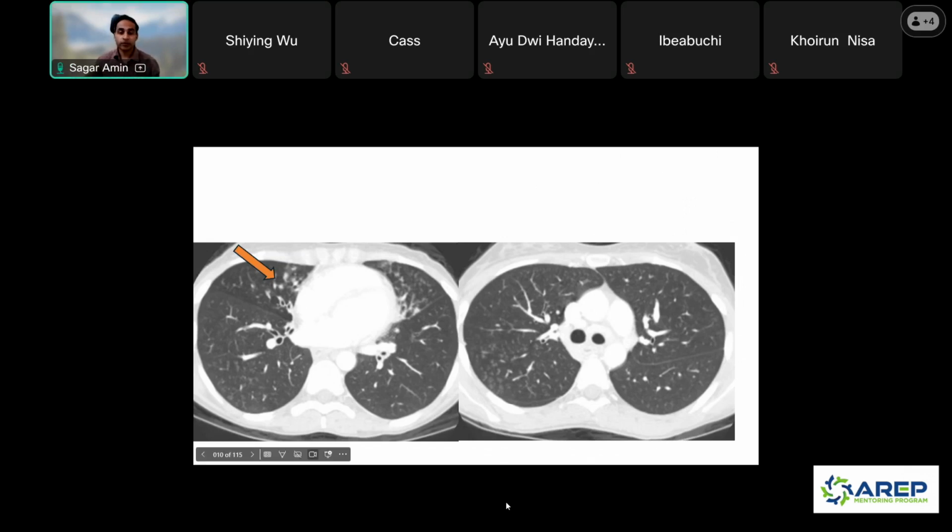All right, so here we have a couple of axial images of the chest. It looks like it's in the mid chest, and you can see the right middle lobe, lingula, and the lower lobes here. I have an arrow on the abnormality. You'll notice that there's some bronchial thickening, as well as these nodules. Now, these nodules are within the center of the secondary pulmonary lobule, so I'd call these centrilobular nodules, as opposed to perilymphatic nodules or randomly distributed nodules, because each of these nodule distributions has a differential. But the most common would be a centrilobular nodule, as you see in this case.